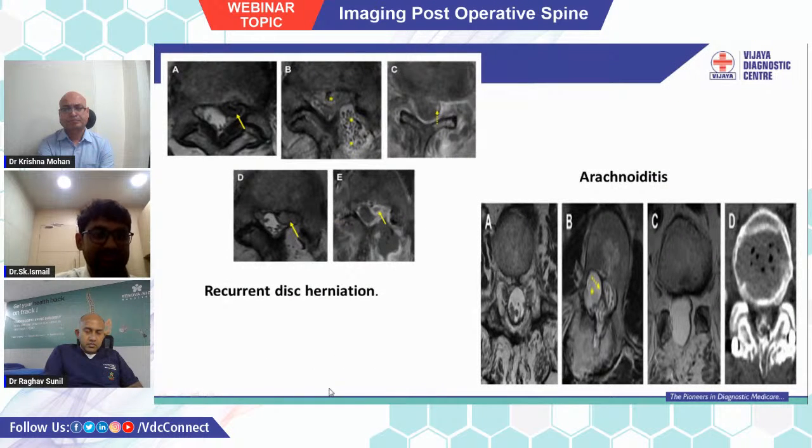And these images show the preoperative disc. This preoperative MRI shows a left paracentral disc bulge that is causing lateral recess narrowing and compression on the traversing nerve root, and postoperative thrombin surgical packing. So that gives this characteristic speckled appearance, and this hypointense appearance is also seen in hemostatic placement or surgical placement following discectomy, which we see adjacent to the end plate, especially in cases of microscopic discectomies.